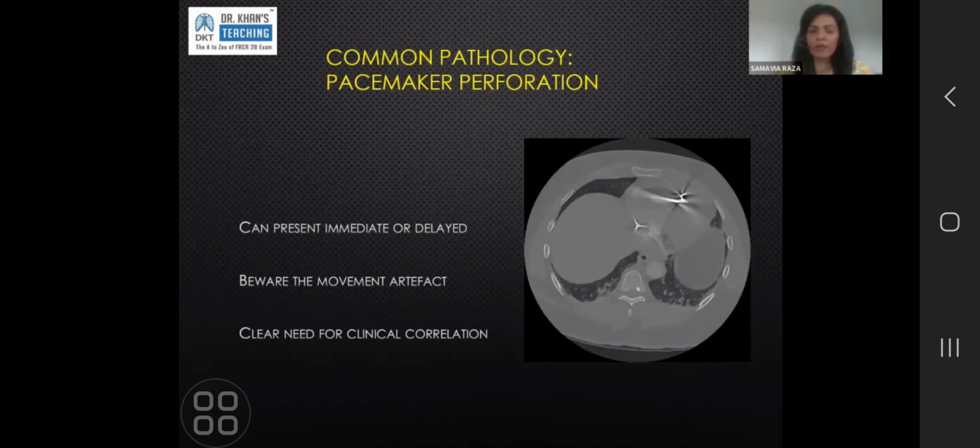The thing to remember with pacemaker is that the extreme tip of the lead is not the bit that paces. I don't know if any of you have seen a pacemaker, but a pacemaker is made in such a way that just before the tip there is a short segment that is slightly thicker.